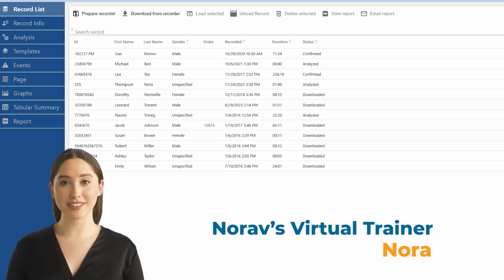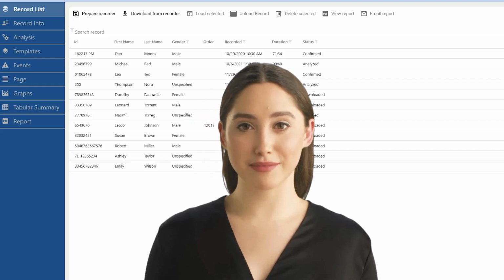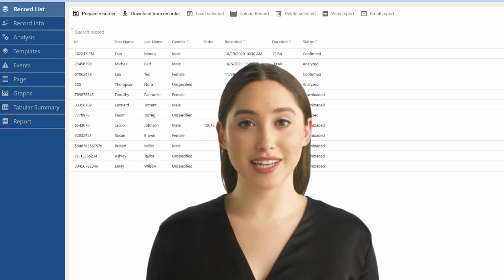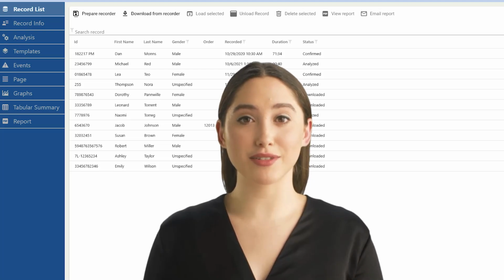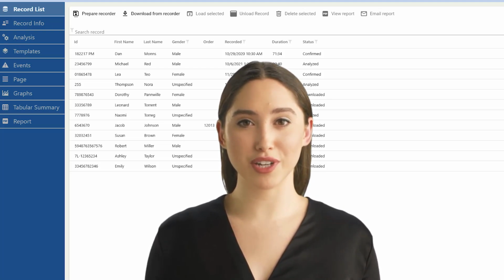Today, we're diving deeper into our latest Holter software, NH301. This video will focus on preparing for Holter recording and downloading Holter recording data. Once you've got your NH301 analysis system all set up, you're ready to dive into Holter recording.